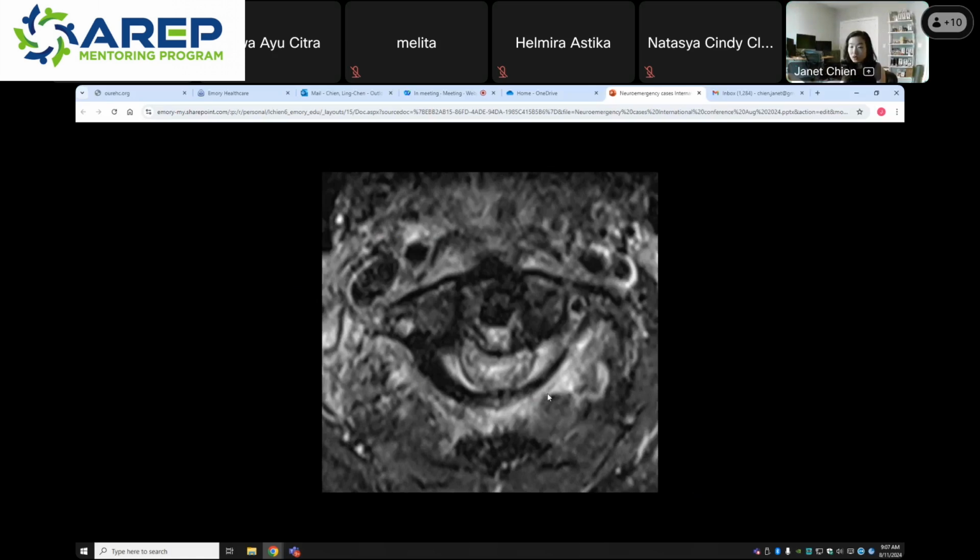This is axial T2, so we saw similar findings on the sagittal. There's epidural hematoma surrounding the dens, and then there's also high-grade tearing of your transverse ligament. So your transverse ligament and the alar ligaments that we talked about are the two major stabilizers at the cranial cervical junction. And then this is your contused cord with T2 hyperintense signal abnormality and some epidural hematoma.